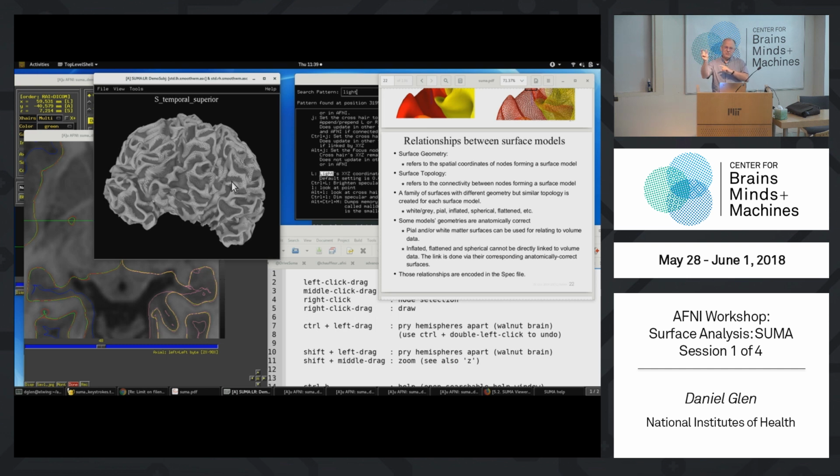And he looked for the differences between that in an autism study. And it's pretty cool. Correlation actually happens pretty symmetrically. If you look at the contralateral side, it happens almost exactly in the same equivalent place as on the one side. So you always have this symmetric thing going on.